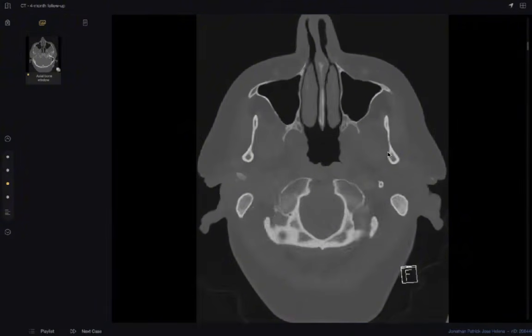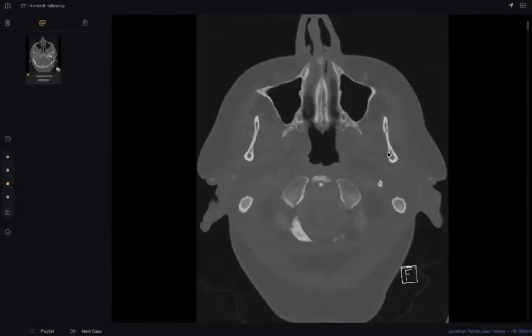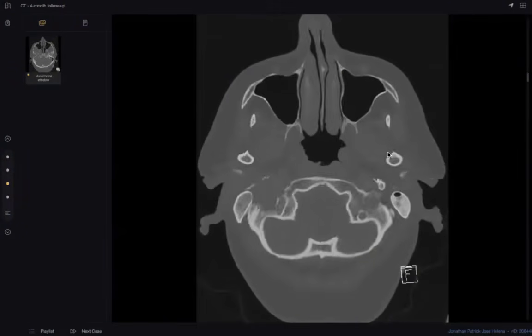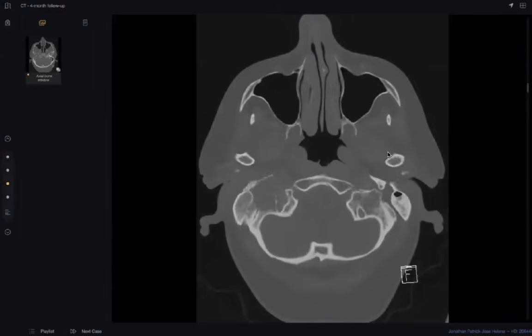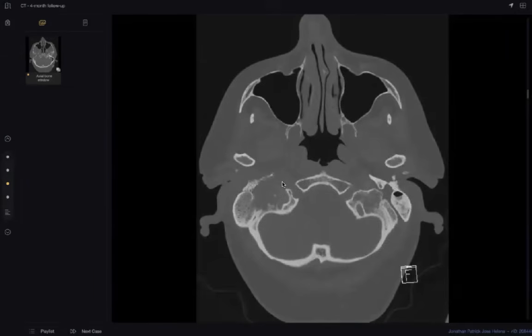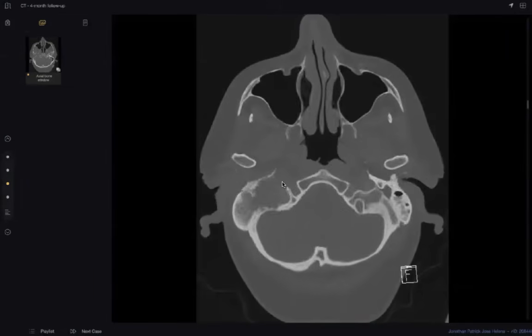Yes, okay. Where is the hypoglossal canal? Where? This one. Yes, okay. So, what do you think?